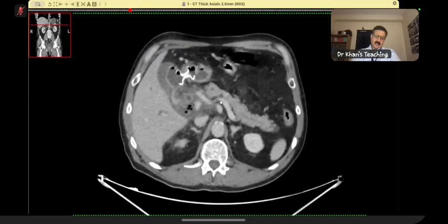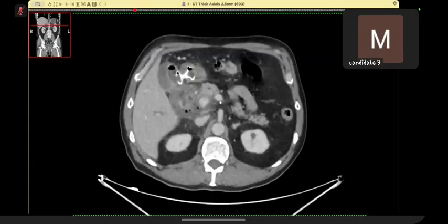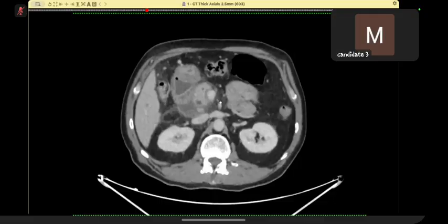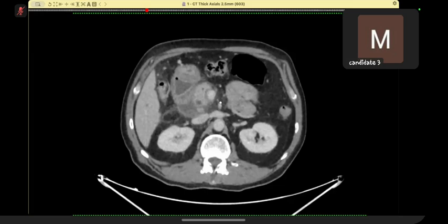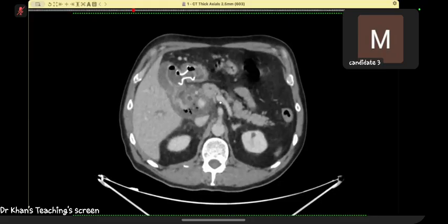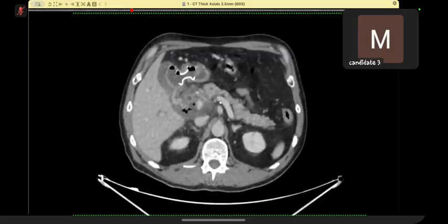So maybe, if this procedure was done, possibly they tried to drain the gallbladder. Why will they drain the gallbladder like this? This metallic density is not typical for a biliary stent; its shape is not ideal for that. A gallbladder communication could be made in case of obstructive jaundice if it was markedly distended. One possibility is an open cholecystostomy, or some internal drainage procedure, or there was some pre-existing fistula there.